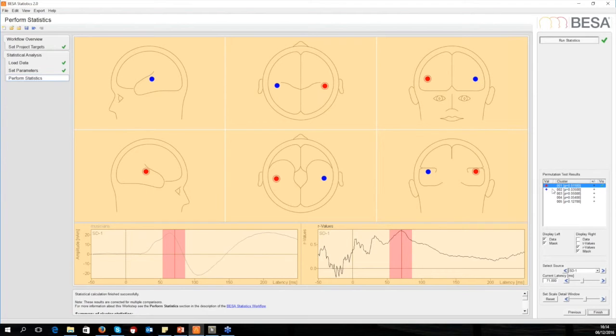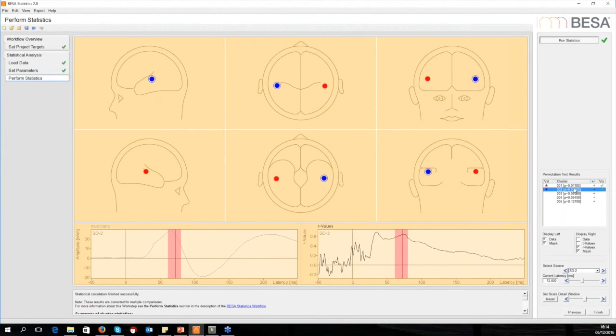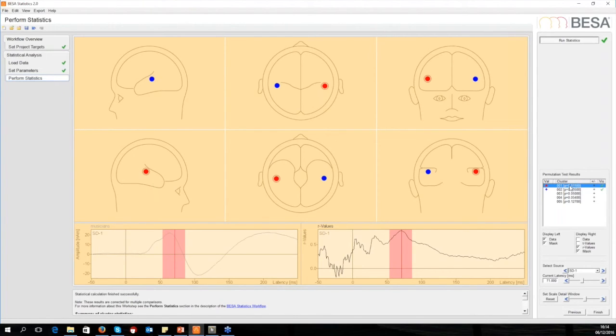The trend is one that didn't quite make it to significance, but is less than a factor of 2 outside of this significance. Remember that because it's a two-sided test, even though p is smaller than 0.05, it's not quite enough here to get us to the full significance level. And the interesting thing is, first of all, we can see the baseline effects are no longer significant.